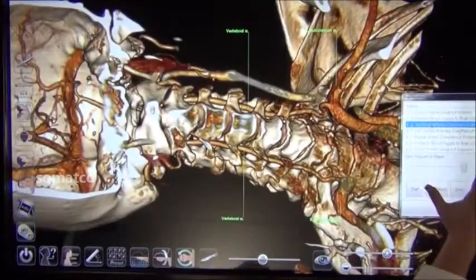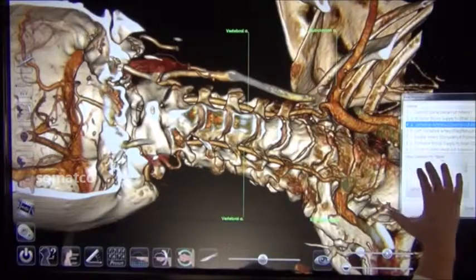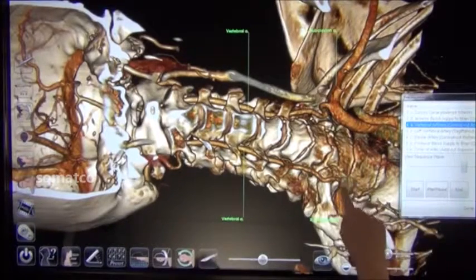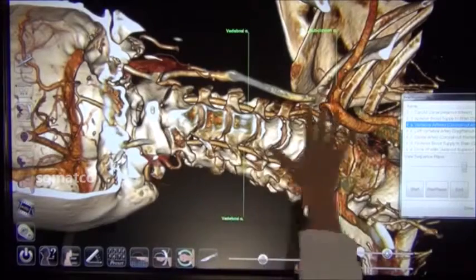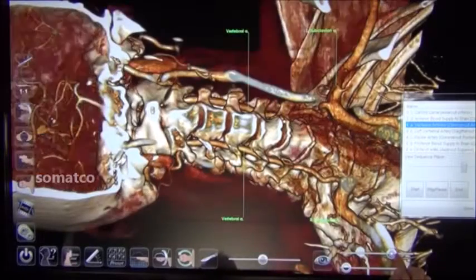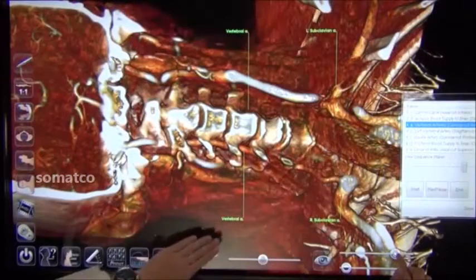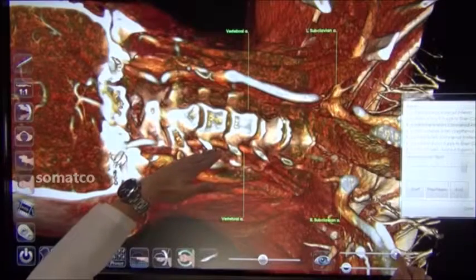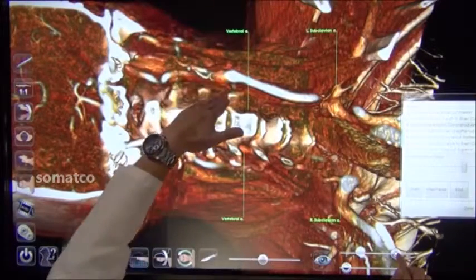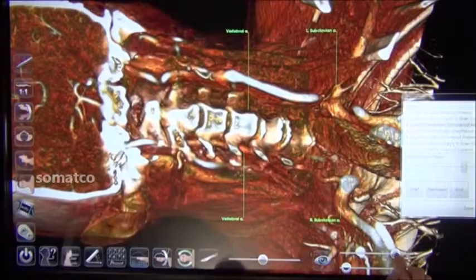The alternate blood supply to the brain is covered in the 4th section within this view sequence. Here we see the vertebral artery after having removed all of the structures located anteriorly. By putting back in some of the more superficial structures, we can see the depth of the vertebral artery in relationship to the structures both found superficially and more deeply in the neck.